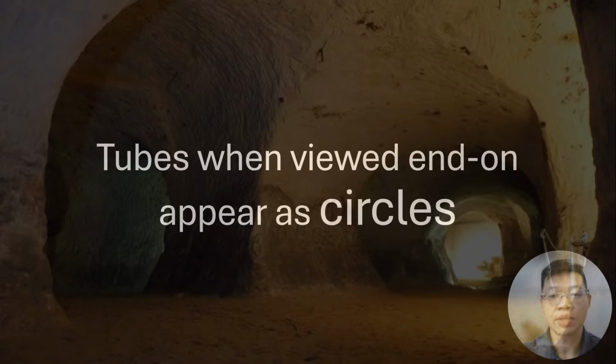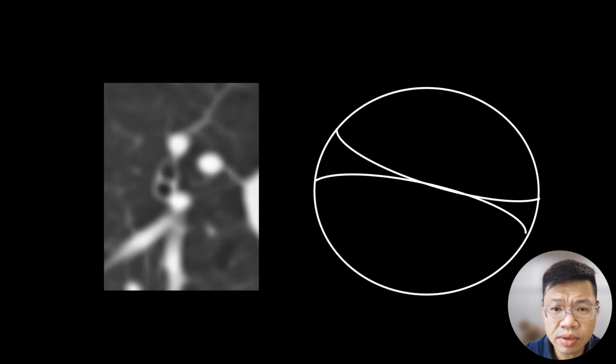Now, during bronchoscopy, when we are moving inside the airways, we are essentially viewing a series of circles, just like the entrances within a tunnel. As you can see, if all we see are holes, all we have to do is just to draw the holes of the same size and the same branching angle. So on the CT scan on the left, if you were to see two holes stacked up like this, all we would need to do is to draw a circle and draw the branching angle exactly as illustrated.